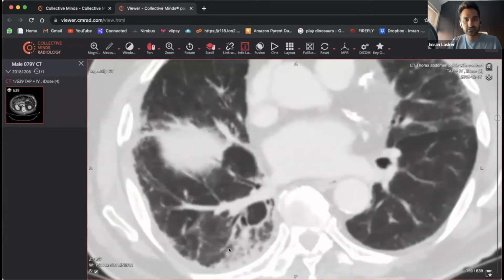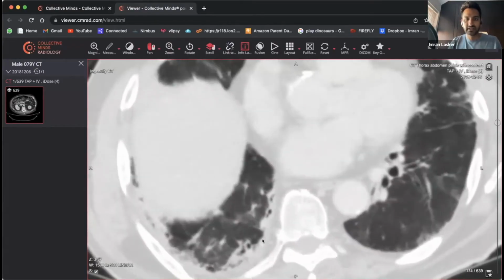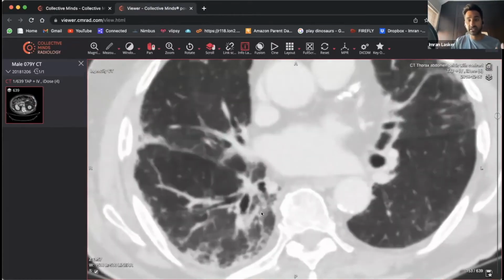And as you scroll through, there's all this gunkiness sitting over here as well. And again, the bronchus and the bronchioles, as they go down, they seem a bit bigger than they really should be and very, very thickened. So you're looking at something that looks along the lines of maybe some traction bronchiectasis. So you've got these tubes, and then some of the lung parenchyma, because it's fibrosing and pulling away, is pulling some of that tubing, and you end up getting a sort of zigzaggy appearance.